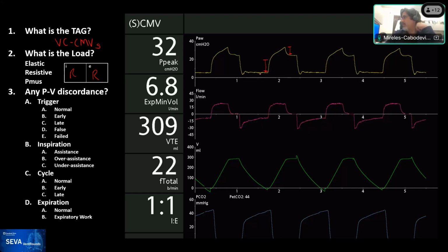Rob? Yeah, this relates to what you said at the very beginning. In the ideal waveform, you have a rectangle on top of a triangle. Here you have basically a parallelogram on top of your triangle for resistance. So that doesn't have parallel sides. So that tells you something's wrong, right? Right.